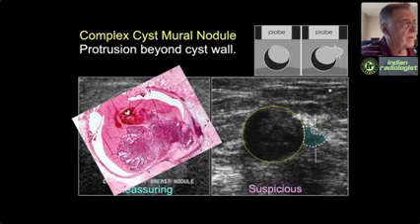Number one is the resistance of the surrounding tissue to growth of the lesion, and number two is the aggressiveness of growth. But when you're surrounded by fluid, there's zero resistance to growth in any direction. And so benign and malignant lesions grow exactly the same inside a fluid. So you learn nothing by evaluating the fluid surfaces of this mass.